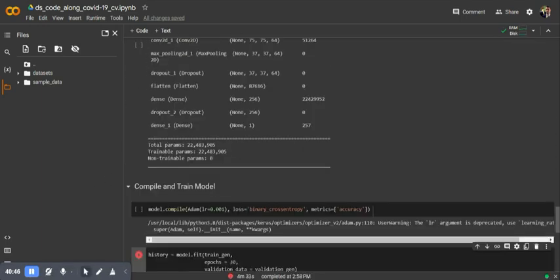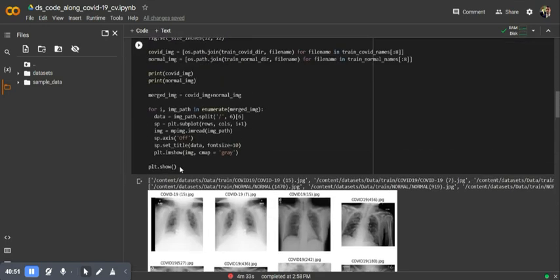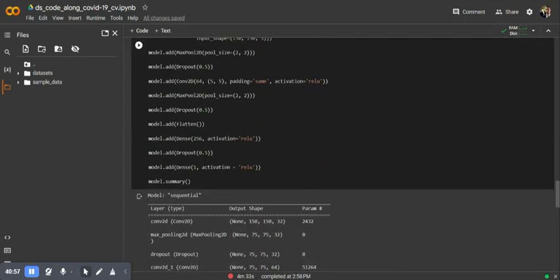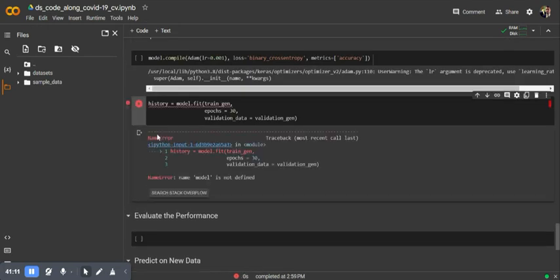I've just stopped the training because I've realized I've made a fatal error in my over eagerness to copy and paste. I hope you spotted it, but this should be sigmoid because it's a binary output. So let's start that again, shall we?